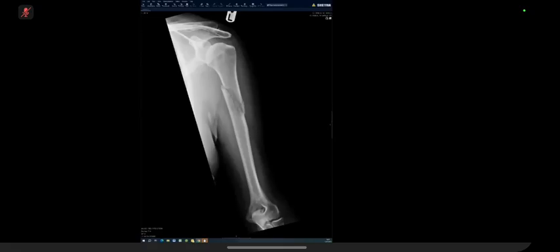In this age group patient, I would like to know the age of this patient, as my differentials would be dependent on that. 65. Yes. So at the age of 65, I would first consider a diagnosis of possibility of metastasis. A second possibility could be myeloma.